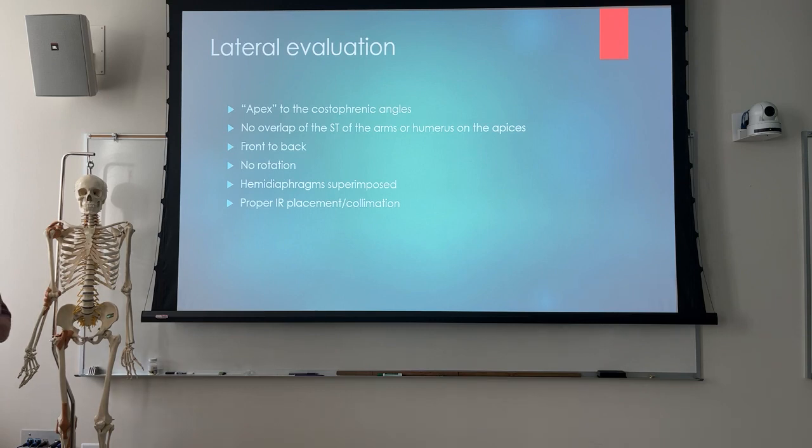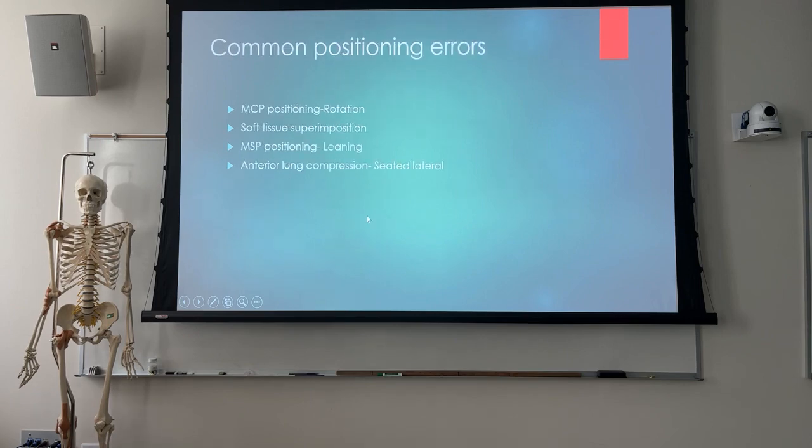Half an inch is pretty small, really. So, you know, I'd be a little more liberal with that. And then proper placement and collimation, not replacement, but placement. So we already talked about all this, and we'll take a look at the anterior lung compression.